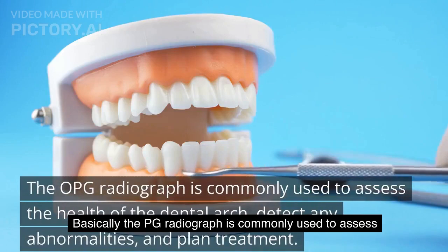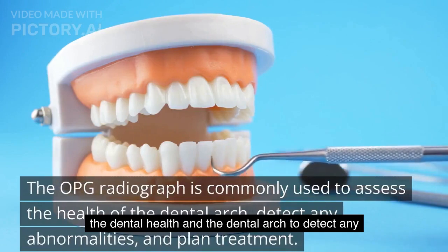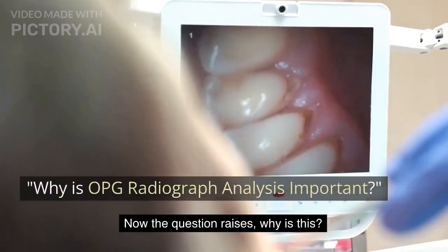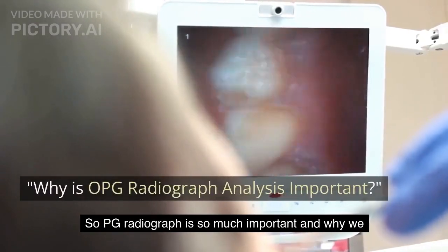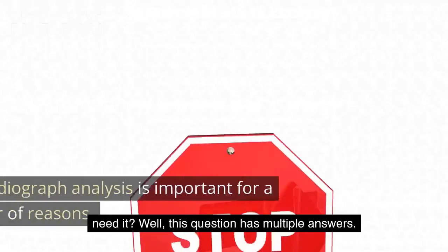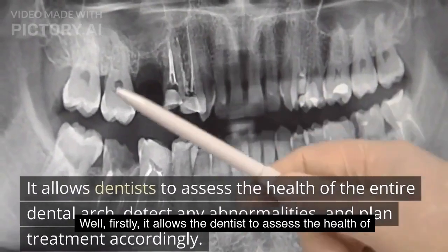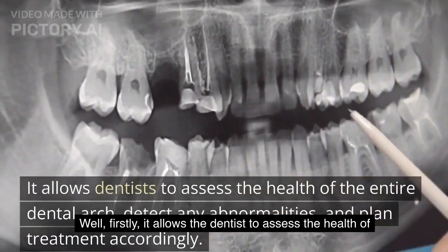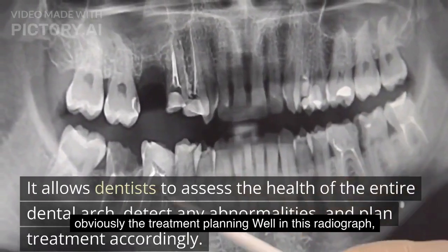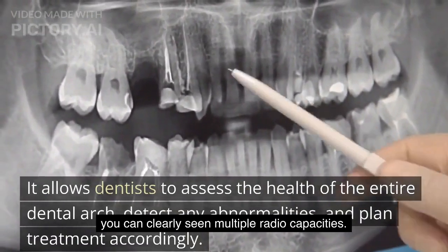Basically, the OPG radiograph is commonly used to assess the dental health and the dental arch, to detect any abnormalities and for treatment planning. Now the question arises, why is this OPG radiograph so important and why do we need it? Well, this question has multiple answers. Firstly, it allows the dentist to assess the health of the entire dental arch, to detect any abnormalities and obviously for treatment planning.